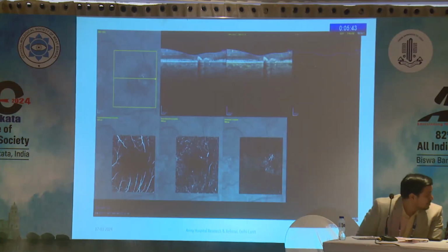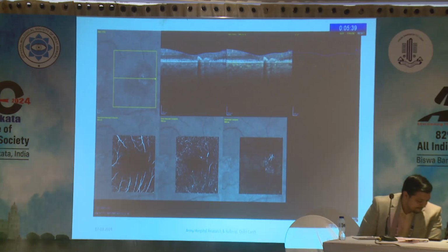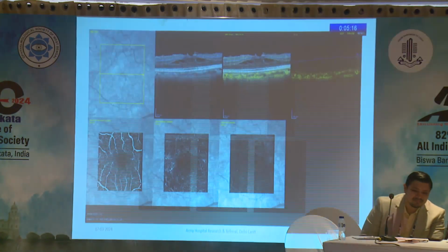A simple diagnosis will be a neovascular AMD. In neovascular AMD, you can sometimes see deep capillary plexus changes which are secondary to the CNVM. But the superficial capillary plexus will remain undisturbed. So that is a pointer in differentiating the disease. So it's not only important to diagnose MACTEL, it's extremely important to differentiate it from the more common treatable diseases.